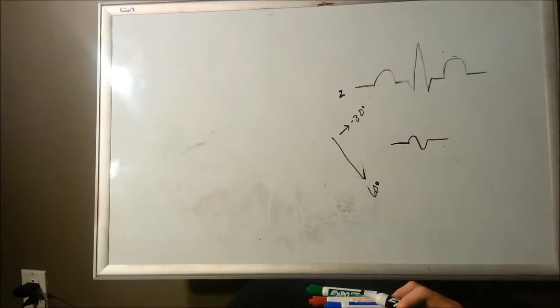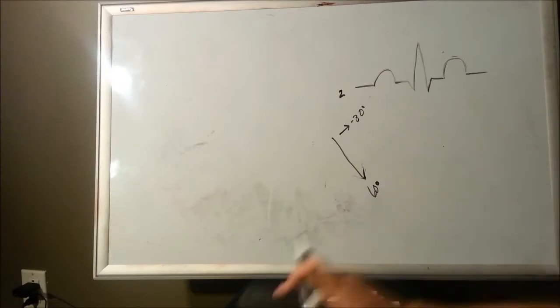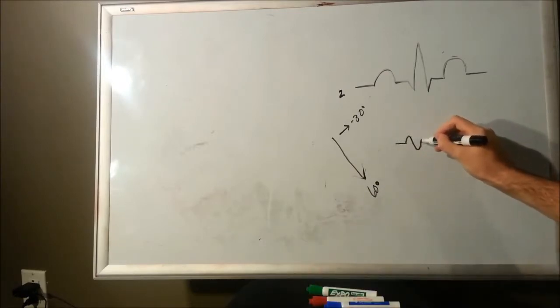And when you see a biphasic, we'll say instead of the P wave, it's going to be a biphasic QRS.